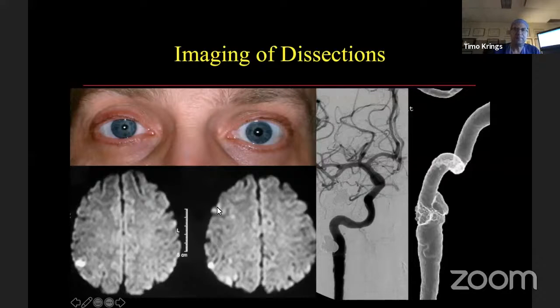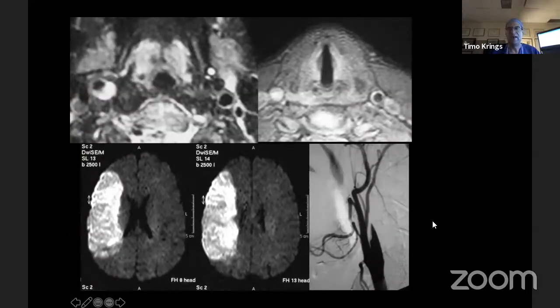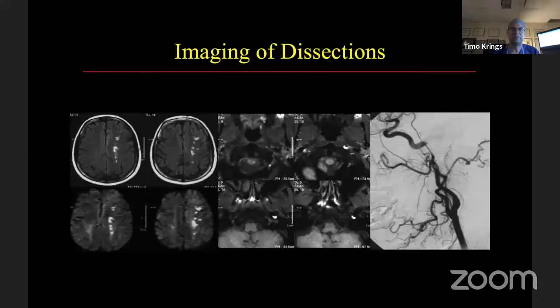If you have multiple embolic strokes in erratic-looking vessels with a double lumen, think about dissections. If you use your T1 fat-suppressed images and see a crescent-shaped area of mural T1 hypersignal within the wall, think about mural methemoglobin as a sign for a dissection.